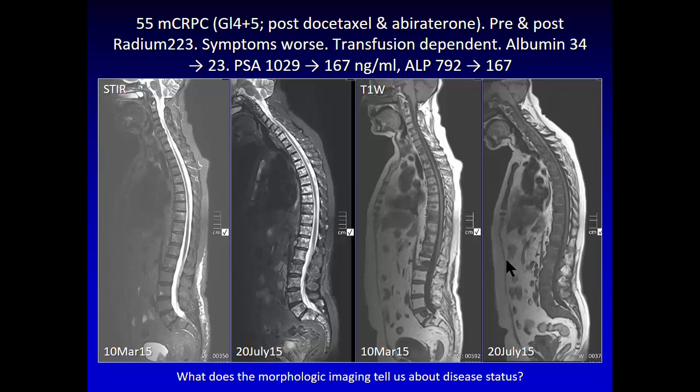So if you were to look at the T1, you would say this patient is progressing. Except your oncologist is going to say, what the hell are you talking about? Look at the PSA value. It's gone from 1,000 to 150. This patient is responding. Right? So you are saying worse, and she's saying better. Who's right? Interesting question, right?